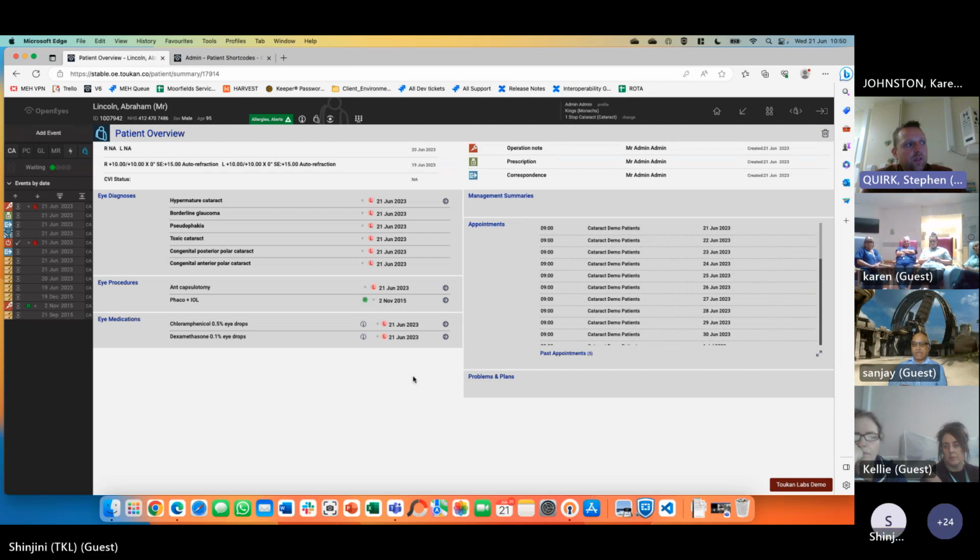Another one was with the operation booking page, and I suppose it's for the staff on the call. Did that look similar to a waitlist page, a waitlist front sheet? Obviously we're trying to move away from paper-based. We've got all the front sheets that we developed now, but if we're using the EPR, if we tweak it and it's customizable, we might be able to get it just the same way, where we remove the paper-based waitlist sheet, and then it goes into the partial book and waiting list after that.